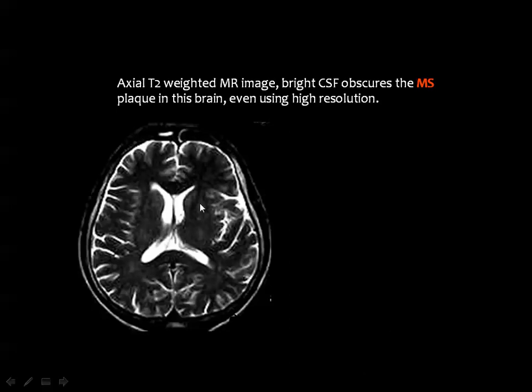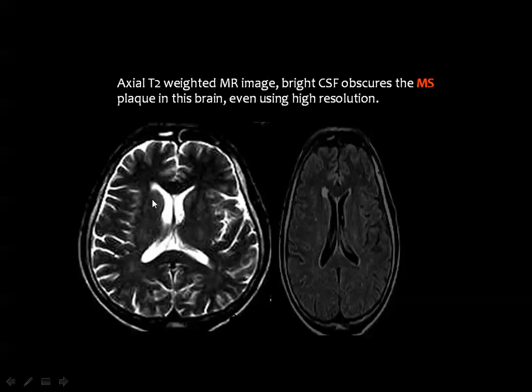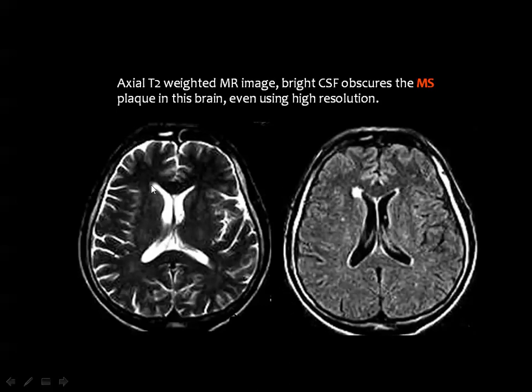Let us look at this axial T2 of an adult brain with a lesion adjacent to the ventricle in this area. This lesion will appear in the T1 black, similar to the CSF, and in the T2 it will appear bright, similar to the CSF.